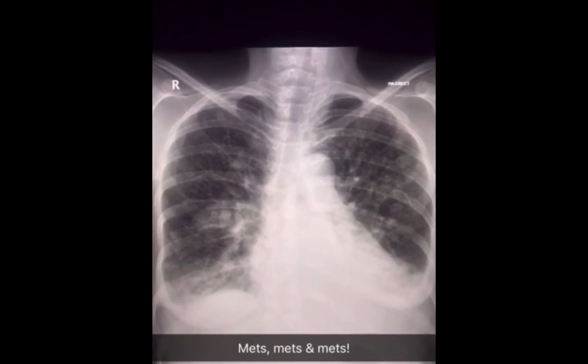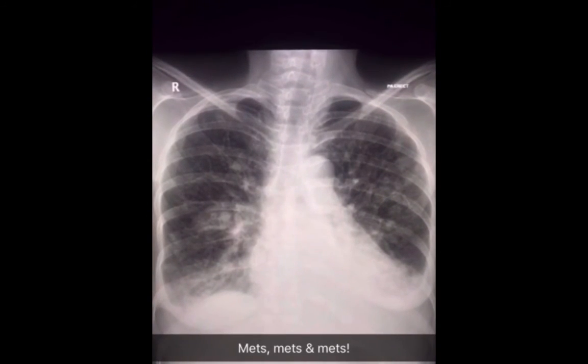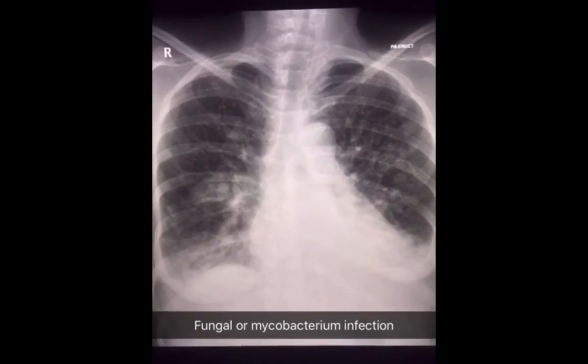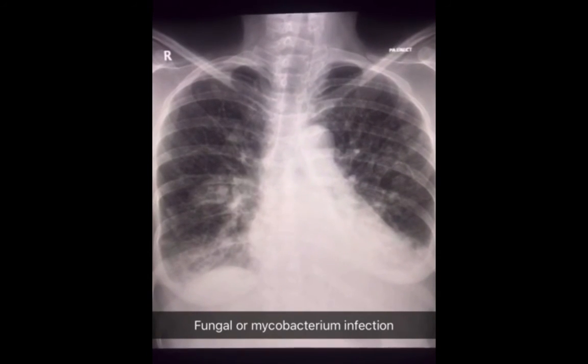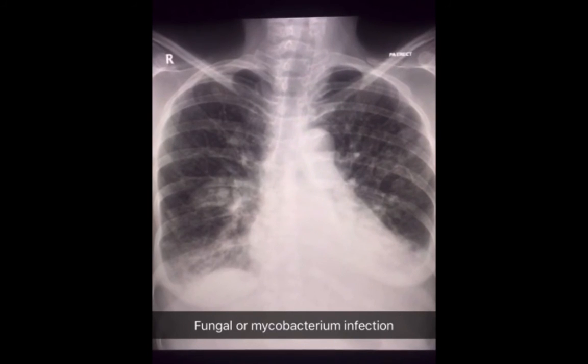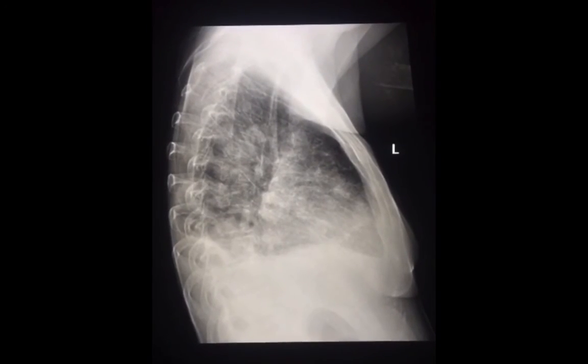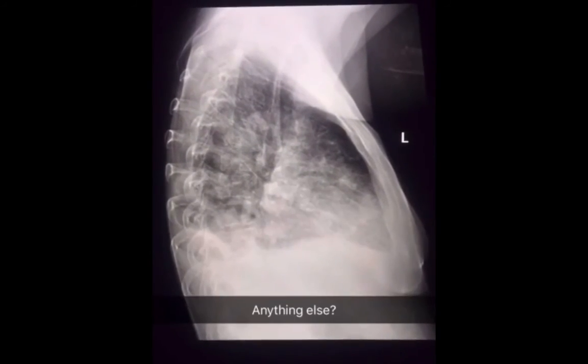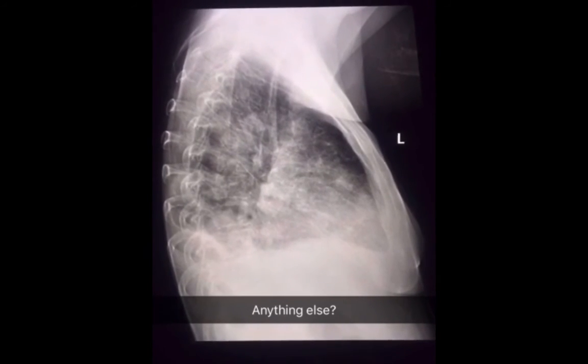Whenever you see bilateral, well-defined nodules and masses in the lungs, the major differential diagnosis is that of metastasis. The second diagnostic possibility would be infection from atypical organisms such as fungal infection or tuberculosis. Now, this is all fair and good information. The main reason I'm showing this case is not for that. Have you noticed any additional abnormality on the lateral X-ray?